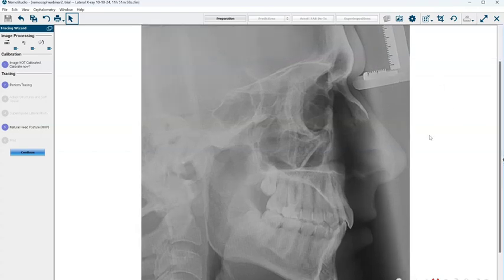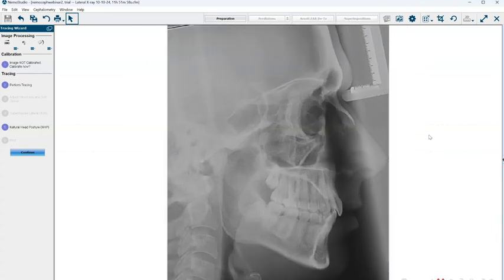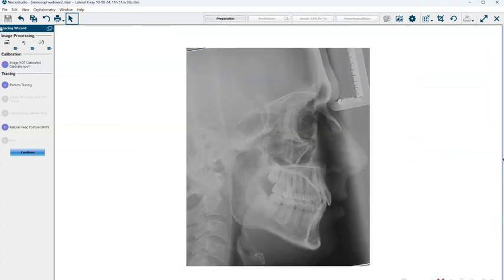It's only more efficient, faster, better, but the general interface will be the same for you. And once we save from the desktop app, we will directly save in the cloud, and we will be able to access the file directly from the cloud that we have seen. Okay, so let's get into the case.